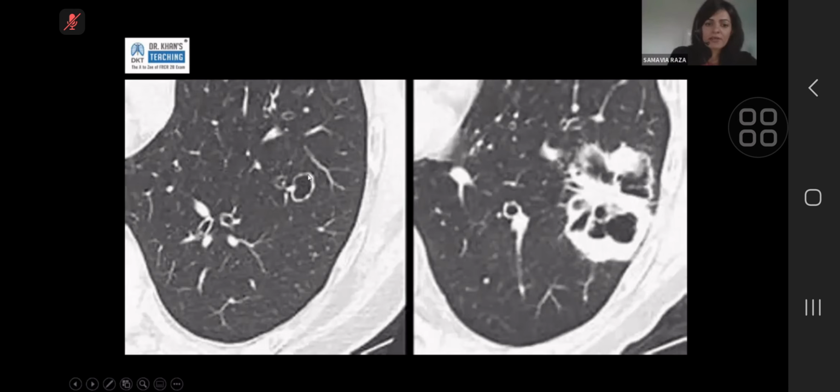If you see irregular thickening, irregular mural thickening, or nodularity of the wall, even subtle, it is better to follow that up along a subsolid lung nodule pathway rather than dismiss it. And in this case, you can see it evolving into a significant sized tumor.